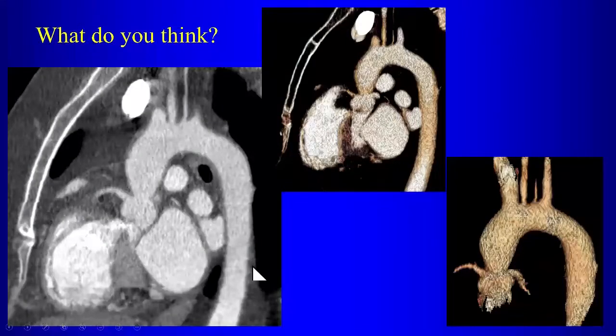Okay, so over at St. Barnabas, what's wrong in this case? Supravalvular aortic stenosis, right. So now we have this narrowing of the aorta above the level of the aortic valve. This can also result in some dilatation of the proximal coronary arteries because of the high pressure flow that will be going through there. So that is supravalvular aortic stenosis.